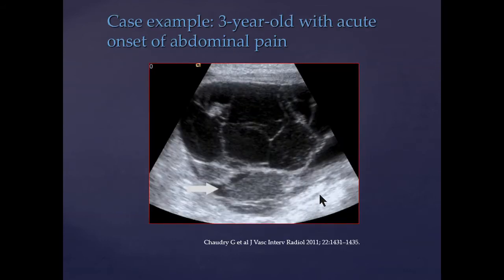see a mass. So here's a nice clinical example of a presentation of an abdominal macrocystic lymphatic malformation. You can see ultrasound is a great start for these, especially in kids, but further imaging is usually pursued. This is very helpful because in contrast to the fluid-filled cysts anteriorly, you see this posterior cyst or two with high-density material in it, and that's blood, and that's why this patient presented, because these typically present with an enlargement and pain due to spontaneous hemorrhage or infection.